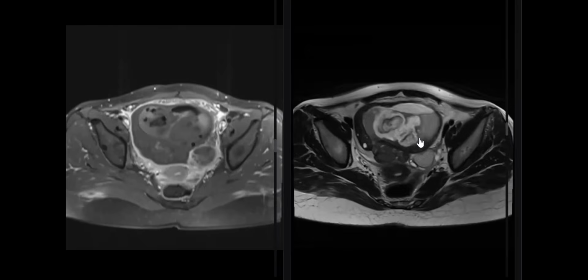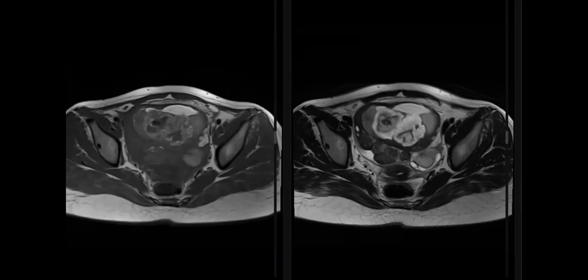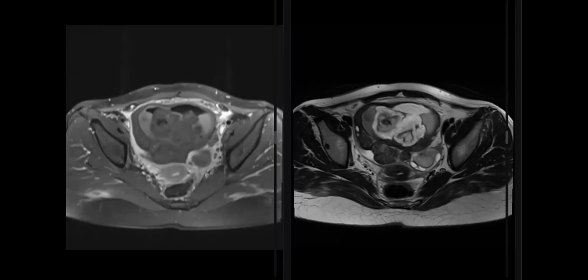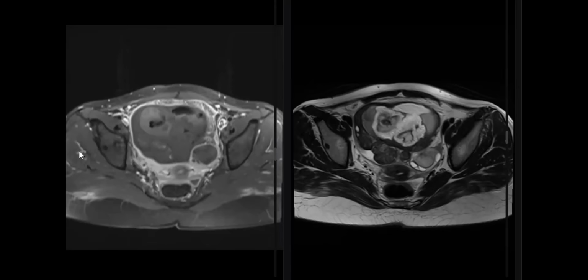By the way, let's see T1 pre-contrast again. This is a dermoid. What about the small cystic structure in the normal ovary? It has high signal. It's also abnormal. This is not a dominant follicle. With high signal we have to look at the fat sat as well. It could represent another dermoid in the left ovary. Very good. For this reason, I told you it's a good long case.